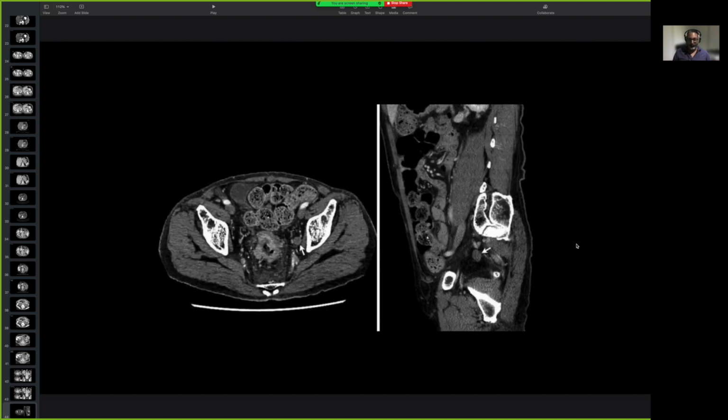Okay, oh my God, well, look at this. First thing you need to know is that it is in the pelvis, and the iliac crest has sort of gone down also, so it's in the lower pelvis. So that seems to be like the sigmoid colon. That looks like the rectum. So these would be rectal cancer with sigmoid nodes and superior rectal nodes.